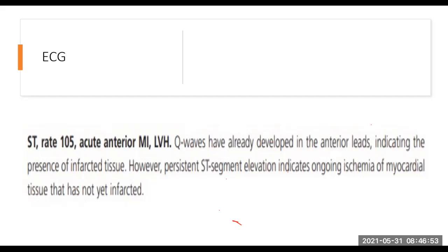All right. So from the history to the ECG, it was more suggestive of infarction. So this is the type of patient that you will treat according to our protocol. This is the type of patient that you will phone the physician about and say, listen, it really looks like an infarct. Then the onus is on the physician. Are they coming? Like in our setting, are they coming? Are they waiting for enzymes? Because if they say they want to wait for enzymes, should something go wrong, they are now liable.